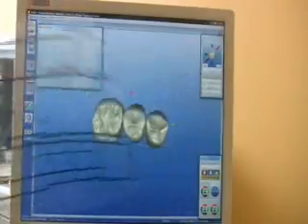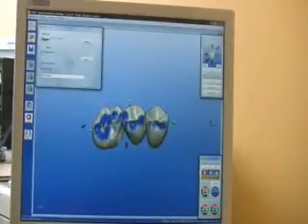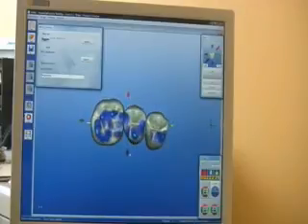The overlay definitely has helped with giving us better proportions, being able to manipulate the 3-unit bridge and getting to where we want to be. We'll go through and bulk up the connectors with the Form Plus tool.